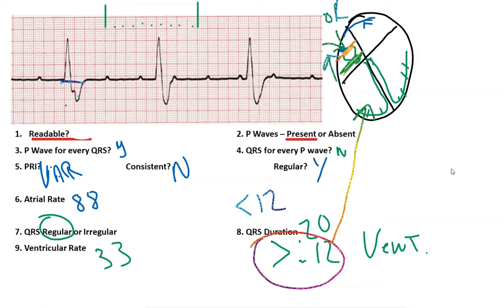By the way, this is firing at a normal rate. That atrial rate is firing at a normal rate. Remember, we're talking it should be firing somewhere between 60 and 100 times per minute. Okay, I think that's it for a complete heart block. I don't want to get into any type of treatment with that, but it gives you an idea a little bit later on in relationship to treatment of complete heart blocks, why some medications may or may not work.